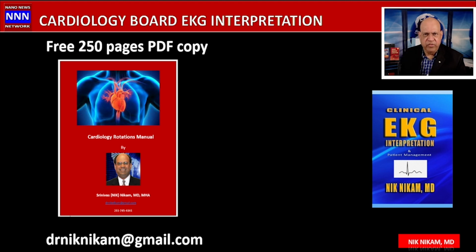So, ladies and gentlemen, this is a very quick synopsis of the EKG changes that we see with metabolic abnormalities and in patients with congenital heart disease.